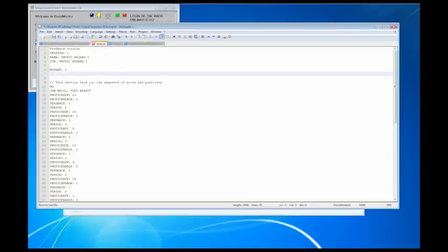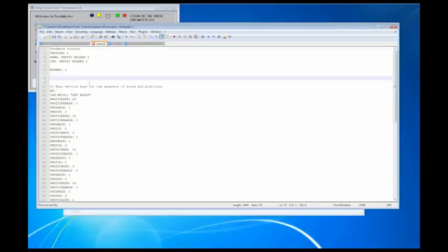Now to create a cycle, you actually go outside of the do and done area. This is kind of an area where you can declare special cycles. So I am going to start by typing beg cycle 1. That just means exactly that. I'm creating a cycle 1.